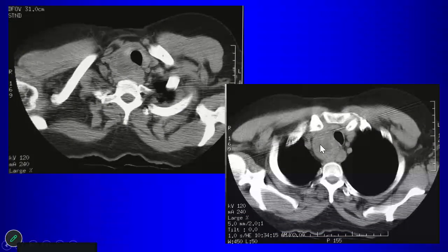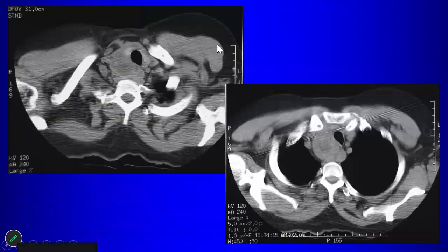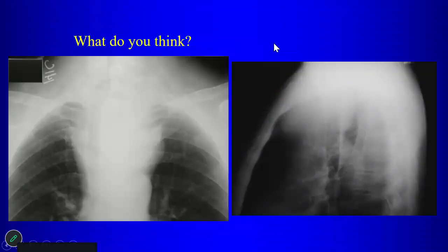And these thyroid masses can extend down the paratracheal region. In most cases, they extend to the anterior mediastinum, but they can also extend down posterior to the trachea there, to the middle mediastinum. So you shouldn't let that appearance fool you. If you see that the mass is deviating the trachea, you do have to think about thyroid masses.